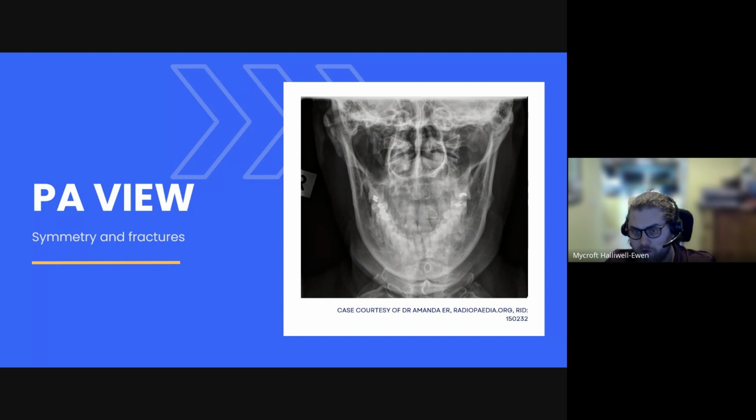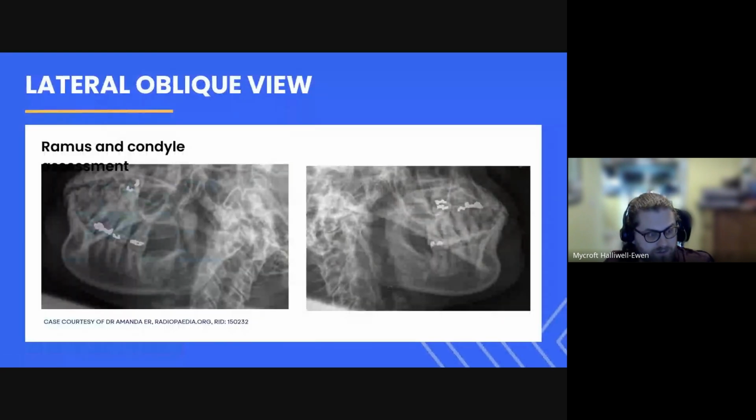So your standard view, have a look at the bone, have a look at the mandible itself, look for symmetry, look for those lines, look for any steps in the teeth, right? Sometimes it'll give us fractures, but we're particularly looking at this outer cortex because that's where it'll be disrupted. And, although the mandible is quite an exposed bone and very vulnerable, it's really quite tough. So fracturing it's not actually that easy, although it is quite common.